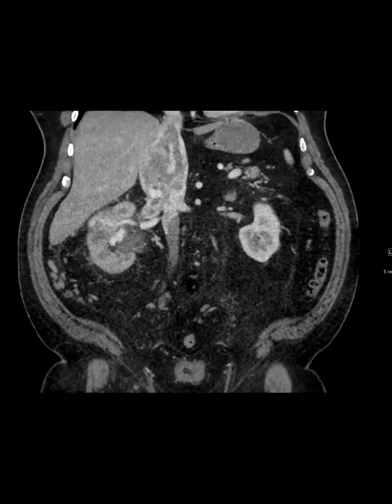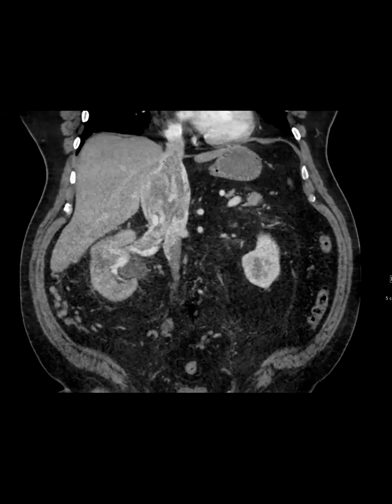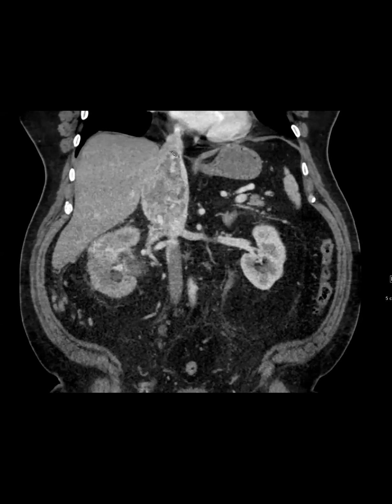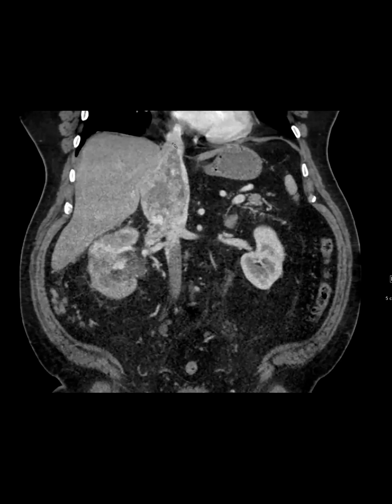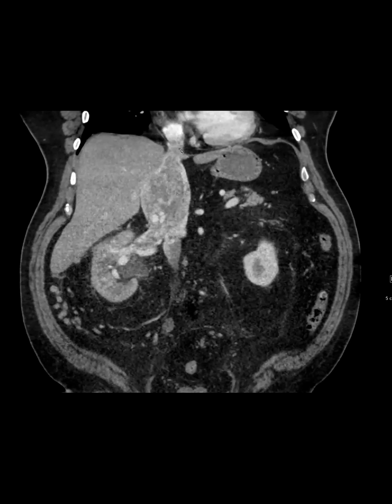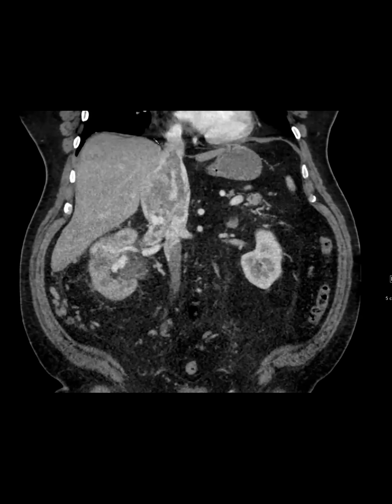Intraoperatively, they were able to go here. So you always want to report where the highest level of your tumor thrombus is, so they know. In this case, they could see that it was going basically into the suprahepatic IVC. It actually went even a little bit further by the time they did the surgery. And they were able to make a hole in the diaphragm and clamp off the suprahepatic IVC, peel out this tumor and resect about 70% of the IVC, and then repair the IVC with a patch.